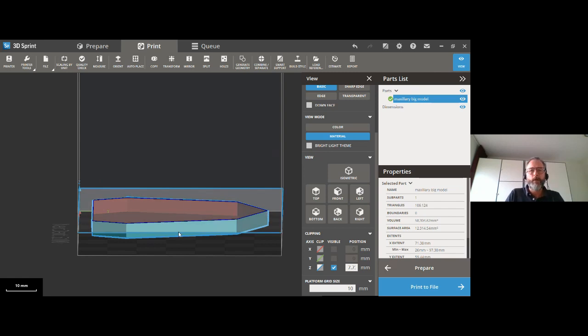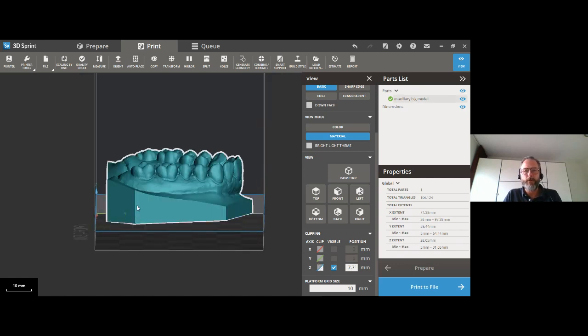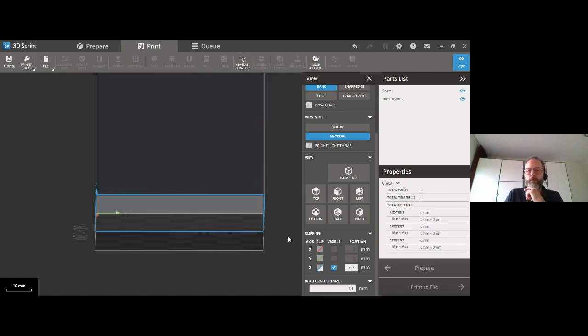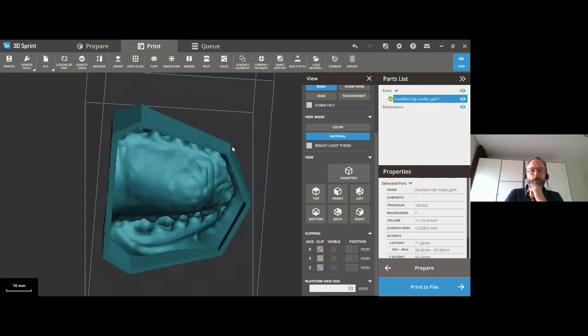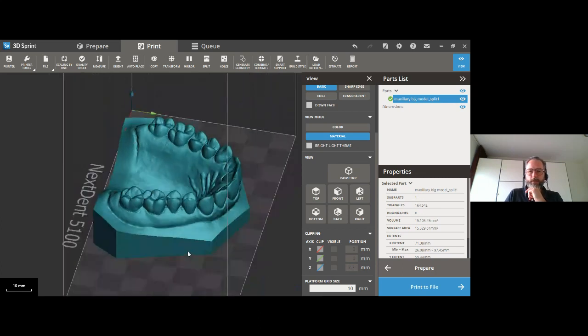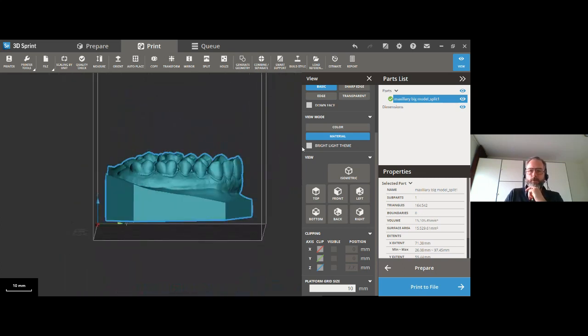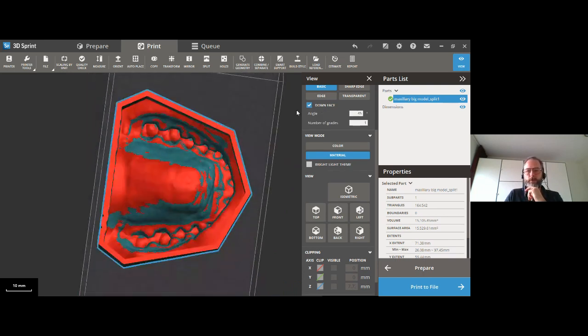Yes. Okay. Then I will have to change models because this is the solid one, to explain it a little bit more in detail. So I will take, first of all, this can be switched off. I will have the file, which is the split one. So what Restein is referring to is that we had the cupping, let's say, but if you want to look at where models should be placed, there is the down-facing option. And let us see the angulation.